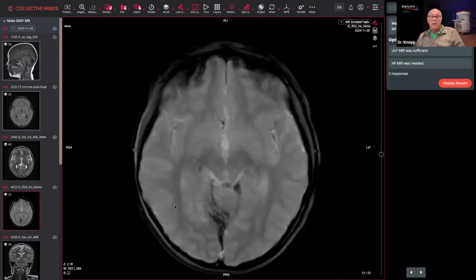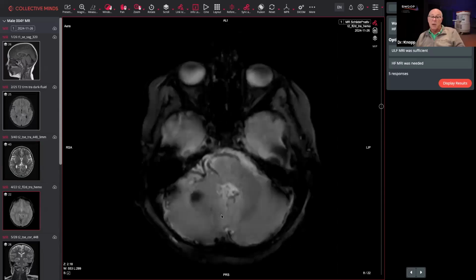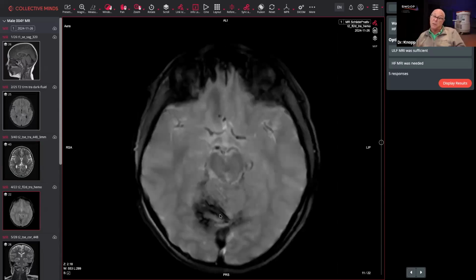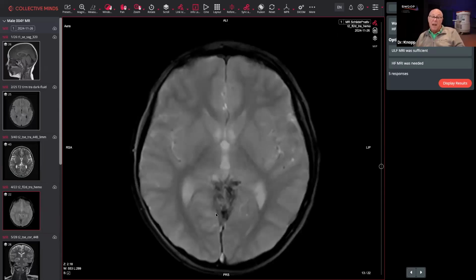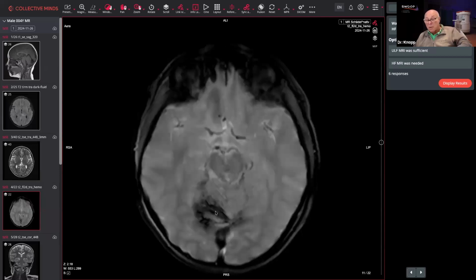What's always important is to see, has this bled? Is there hemorrhage within this? In which case it becomes more immediately apparent. And obviously, this is a gradient echo sequence, and we know on gradient echo imaging, it accentuates susceptibility and hemorrhagic artifact. And we see extensive evidence of prior hemorrhage within this on the surface of the cerebellum.